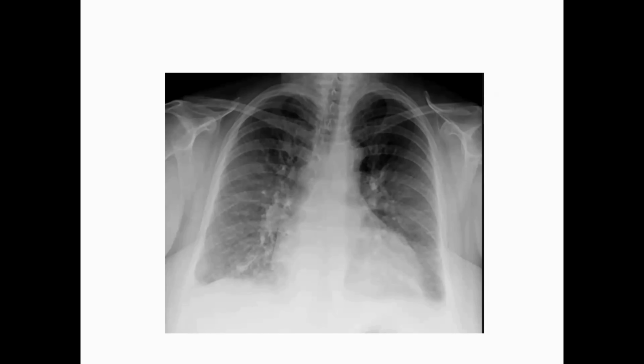Here, if you look, we have the early signs of heart failure and the advanced signs of heart failure. The early sign is interstitial edema, and we have interstitial edema and alveolar edema. If it's interstitial edema, it means we can still see the early signs of heart failure in the X-ray, like this patient. Actually, in this one we can also see a late sign.